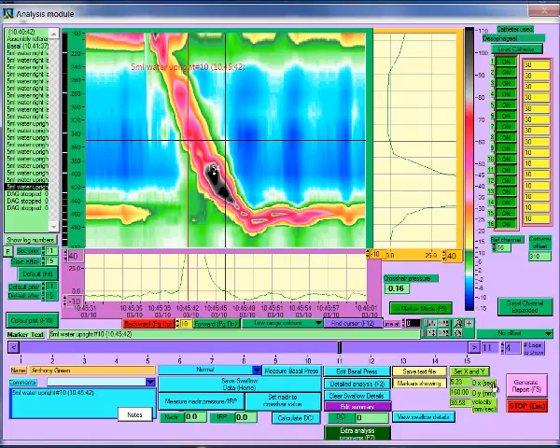Once you have completed analysis of all swallows, click on Generate Report, which will take you to the reporting screen. Alternatively, you can click on Stop, which will return you to the main menu.